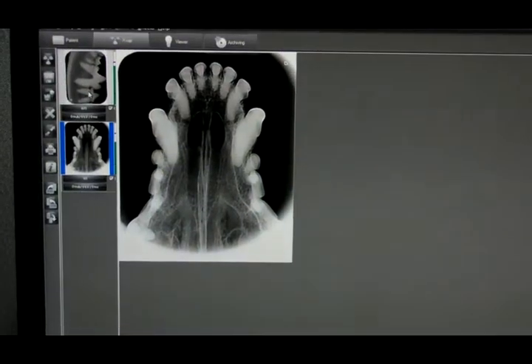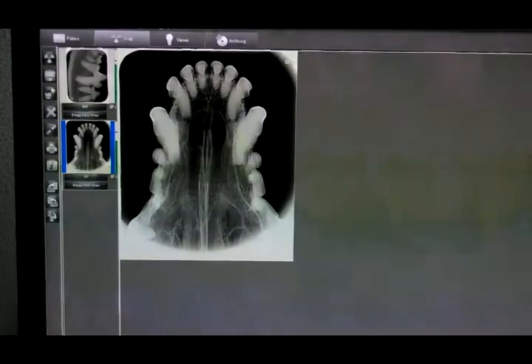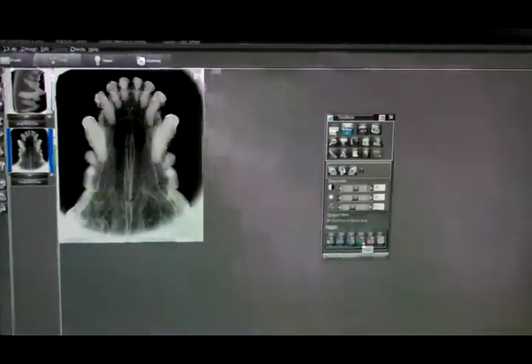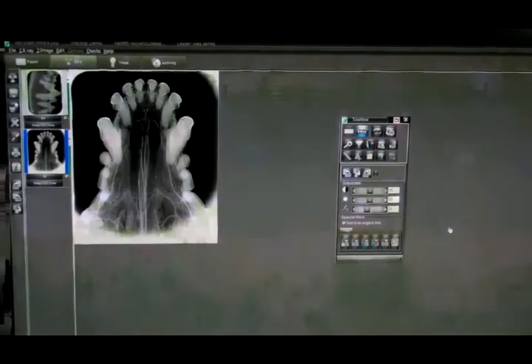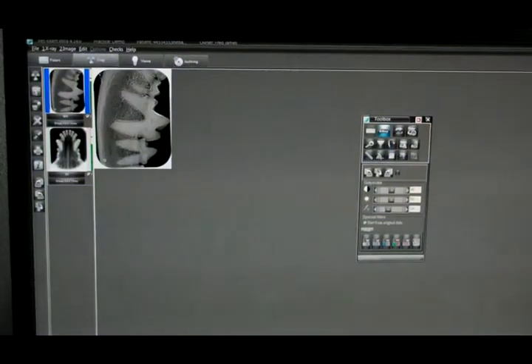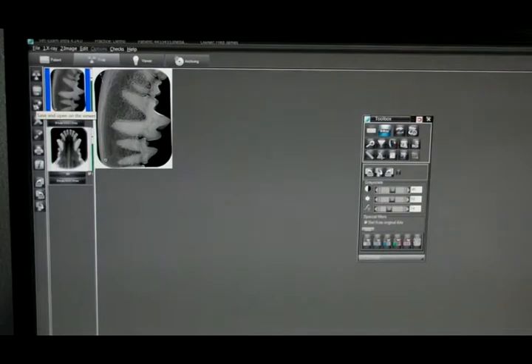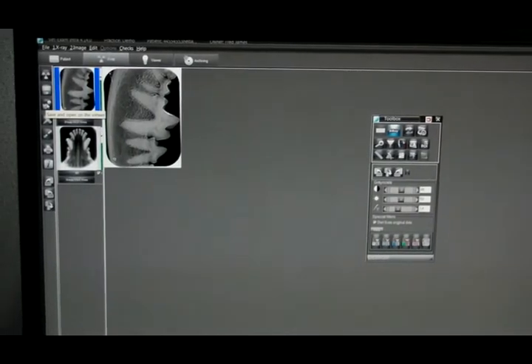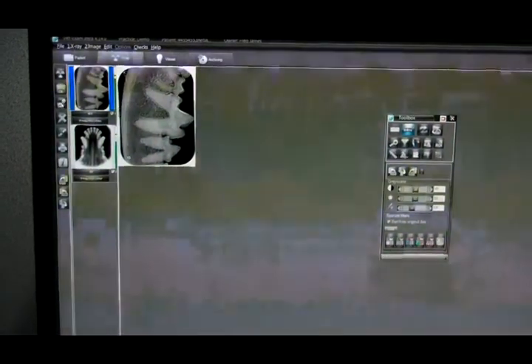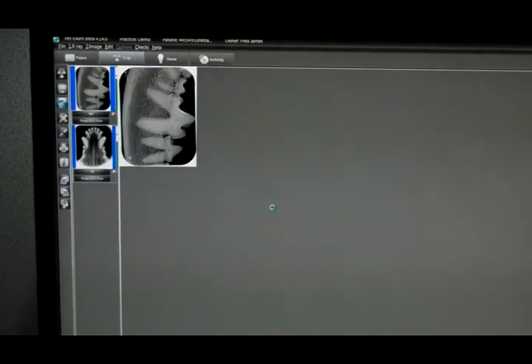Once you're happy and you've saved those images, you can, at this point, if you'd like, just refilter them. I recommend filter the green for endo. This improves the quality of the image. At this point, you can save and open in Viewer. When you save here, this is your first saved. So I recommend you do as limited amounts of movements in the computer at this point, because this is the go back to point when you go to the viewer. So save and in Viewer. This then stores it to the database.